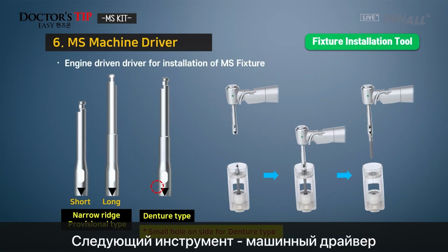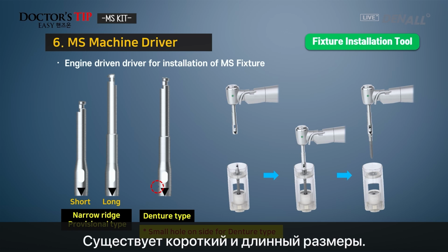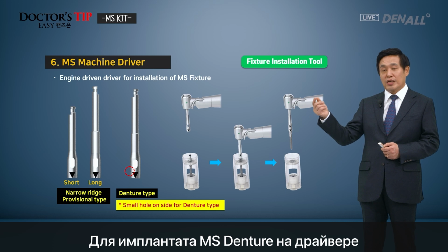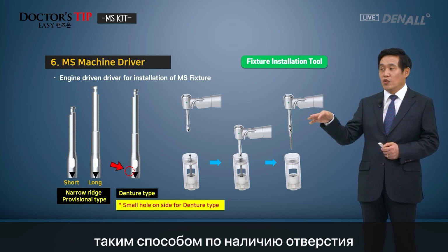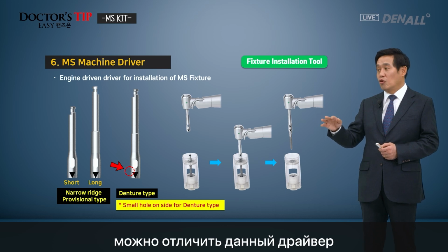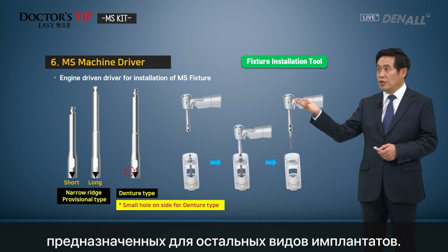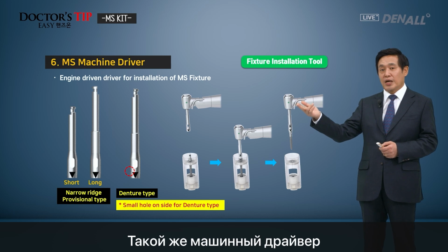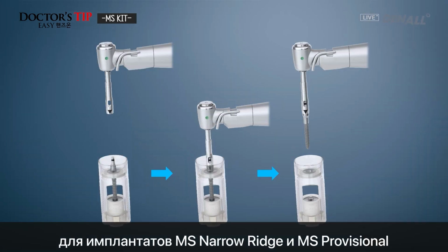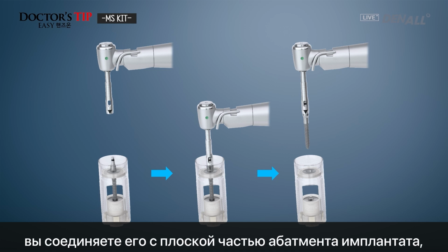Next is the engine-driven driver for installation of the MS fixture. You have short and long types, and for the denture type, you have a bit of a notch or hole at the bottom. So you could distinguish the denture type from other types. And I will show you again in the hands-on. But with this engine-driven driver, the black triangle part, you connect to the flat part of the fixture, then it will be easy to place the implant.